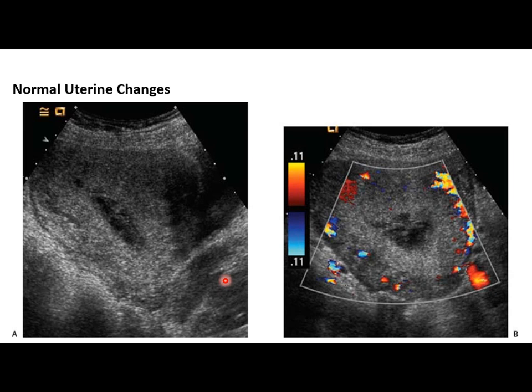During the postpartum, it is normal to see an enlarged uterus with heterogeneous content within the endometrial cavity, and a thickened endometrium up to 20 mm is normal post-delivery, in the absence of any signs or symptoms in the patient.